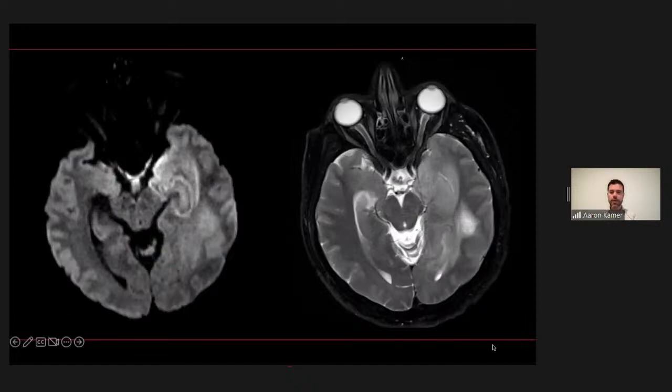Okay, so let me see. I'm going to skip over our first year residents. So Wilfred and Wyatt, you're off the hook this time. Jared, can you tell me what you see on this case?